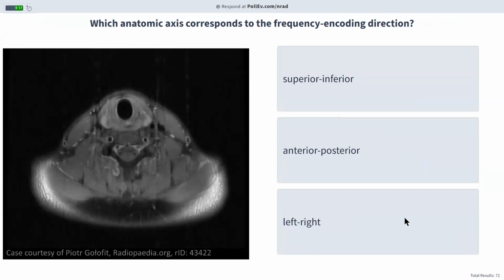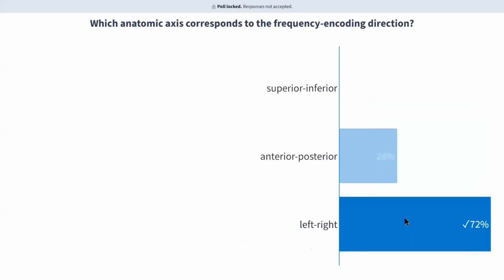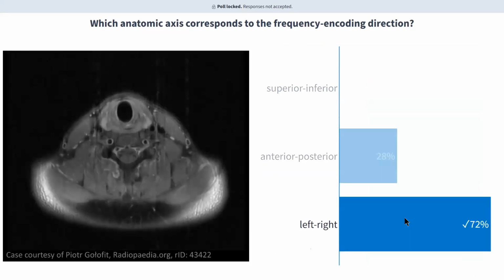So this problem sometimes arises in head and neck imaging where you have artifact that projects over some lesion of interest, and one way to troubleshoot that artifact is to change your phase encoding and frequency encoding direction. Usually the setting is phase encoding direction, and frequency encoding is just whatever is perpendicular to that. So I asked my question a little bit weirder, unconventional way, asking which one is the frequency encoding direction.